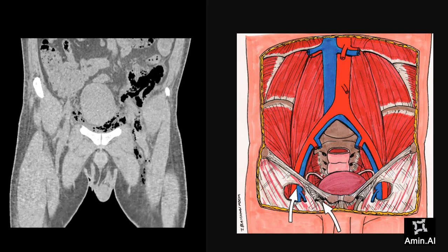This is a coronal image of the same patient and is again compared with a coronal image from the Radiographics article, and this shows the potential direct communications of the retroperitoneal space through the femoral sheath and femoral vessels as well as the inguinal canal region. You can see that there is a potential space, and this process is extending into the thigh through those potential direct communication routes, and the air is extending all the way towards this side.